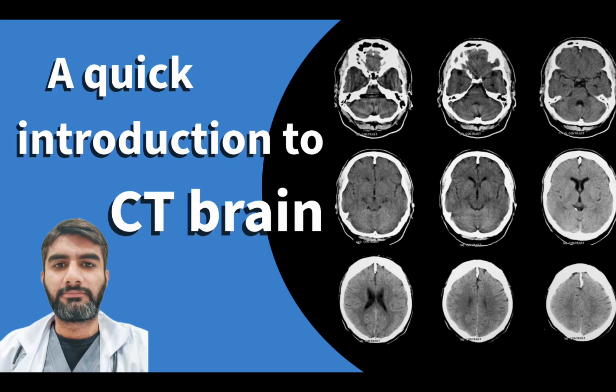So that was all about the CT brain anatomy. Watch it again and again to memorize the important aspects that can be helpful in recognizing brain pathologies.